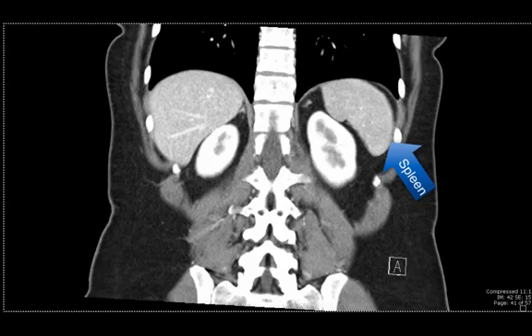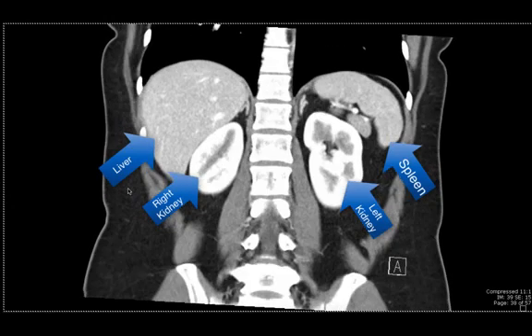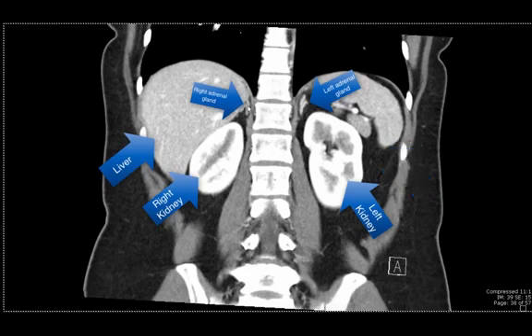You can see its craniocaudal extent in this plane very nicely. Adjacent to it on this image you can see the left kidney, and on the other side of the spine you can see a portion of the right kidney as well as the liver that lives right above the kidney over here. As we scroll through these images, we can start to see the adrenal glands also coming into the picture, this triangular shaped structure that lives on top of the left kidney on the left side and on top of the right kidney on the right side over here.